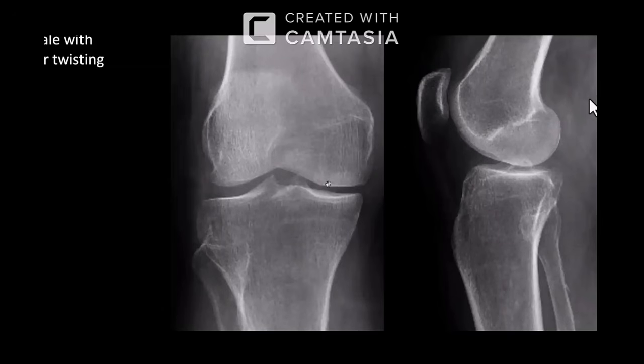So, very subtle though, but you can actually appreciate this area of increased density involving the medial aspect of the medial condyle of the femur.